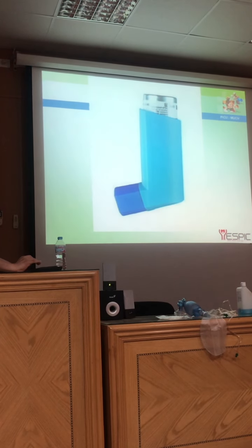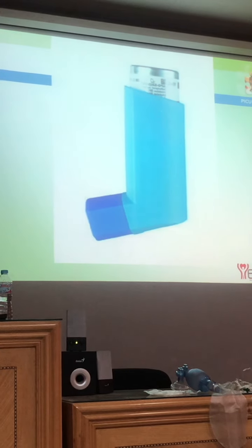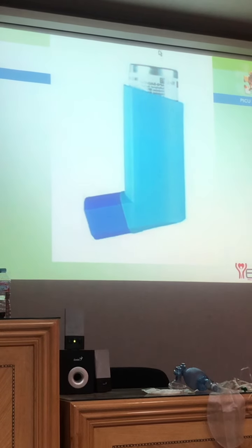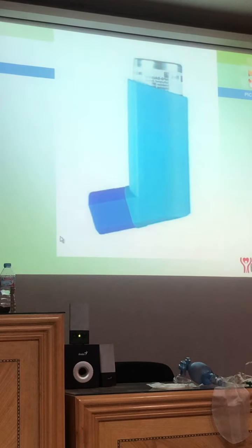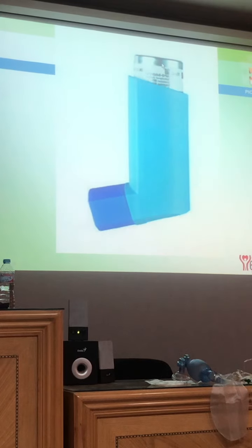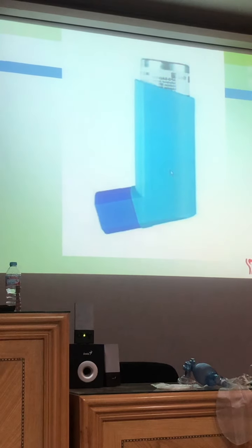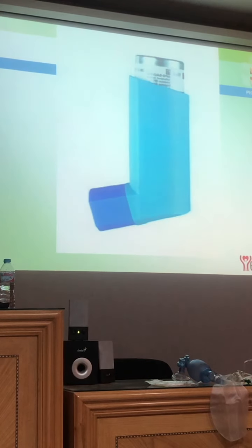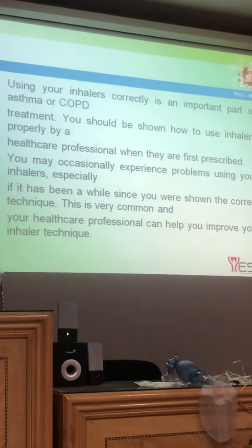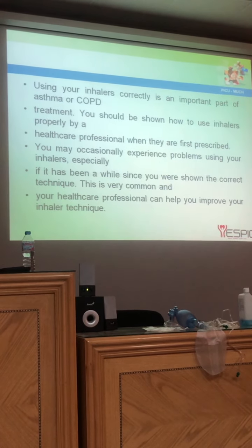This is the MDI, which consists of a cover cap that covers its opening, and a stick or a piece which we push to deliver the drug. The MDI should be held in this manner, upside down, and this piece is put in the mouth of the child or in the spacer, as we will see in the video later. It can be used in asthma and in COPD.